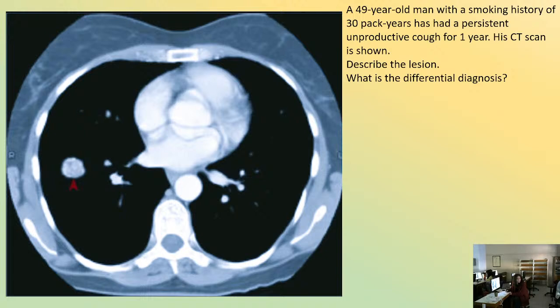I'm not sure, because a lot of lung cancers radiologically appear like a coin lesion, that means with a deceptively smooth contour. So all rules have their exceptions. It's not the only way that lung cancer could appear, but it does so sometimes, and quite often, I'd say.